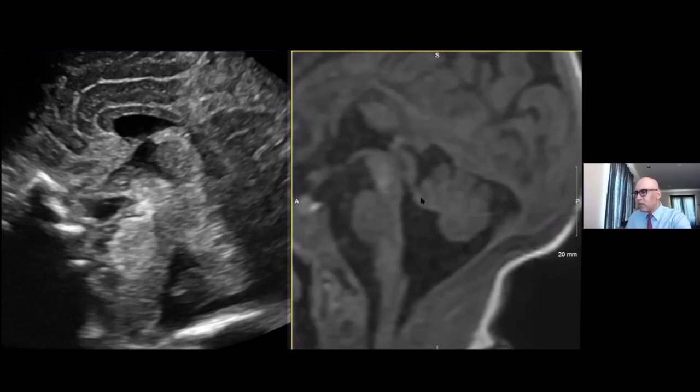In this case, we can see there is hypoplasia of the inferior aspect of the cerebellar vermis, but the vermis is present in nearly its entirety. We can see the superior medullary velum right here, and the inferior medullary velum. A normal cerebellar vermis looks sort of like the character Pac-Man. It's about to try to eat the brainstem. And in this case, most of Pac-Man is here, except Pac-Man has micrognathia. There's a hypoplastic inferior portion of the cerebellar vermis.